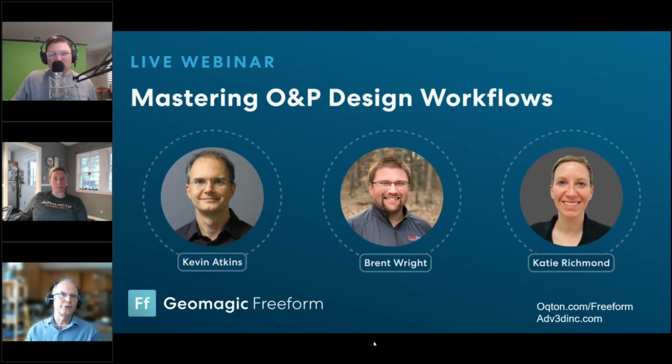That's one of the wonderful things with modeling with voxels, the ability to just munge things together and they all just blend and you just keep on working. You don't have to worry about topology and, oh, did this merge vertice or B-rep vertice edge align with that? Is there a gap? And then the model falls apart. It just doesn't work that way in Freeform. It's more about modeling as opposed to thinking how to model. You just get on and do what you got to do.